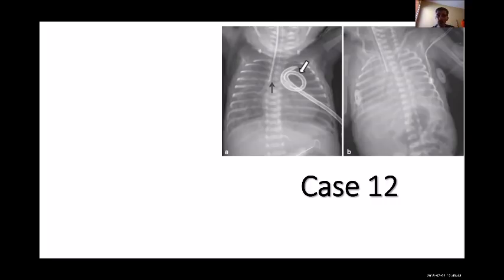The chest X-ray, if you look at the ribs, the spaces between the ribs are compressed. It's not well shaped, so it looks underinflated. And also you can see the diaphragm is going up. The other important thing, it's very hard to differentiate between the right side of the heart and the lung. So the silhouette of the heart on the right disappears.